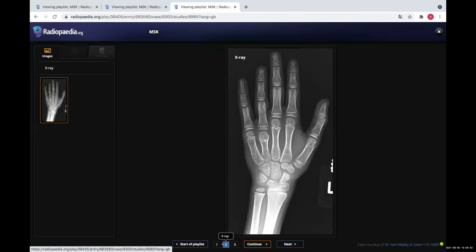Okay. So this is the frontal radiograph of the hand, including the wrist and distal forearm, and there is shortening of the fourth and fifth metacarpals. Great. And there is mild physeal widening in the distal fourth metacarpal. Okay, that's great. Now, what is the definition for the short fourth and fifth metacarpal, specifically the fourth one?